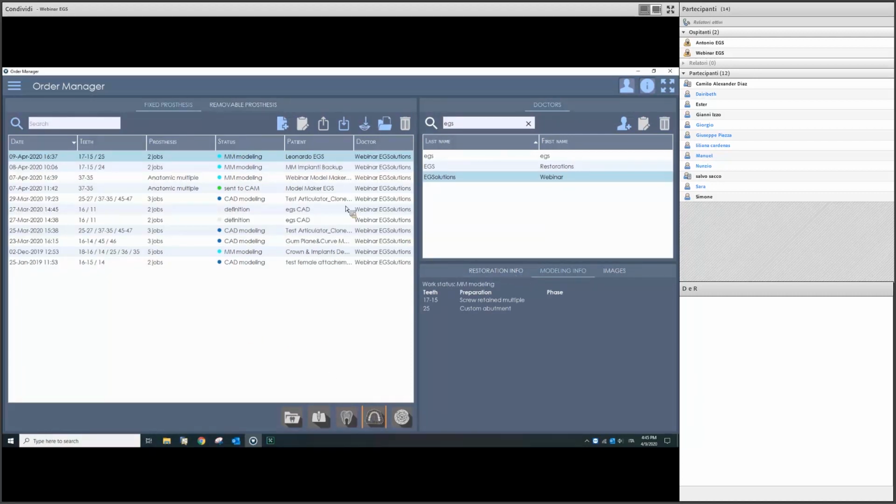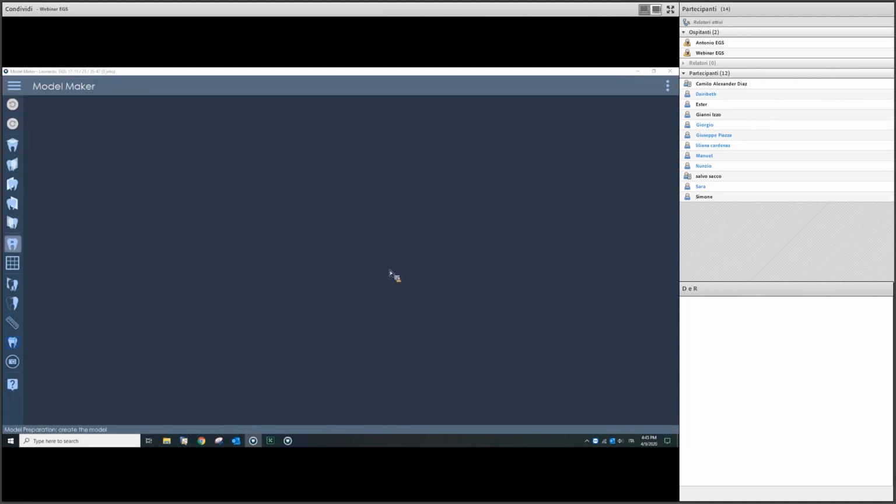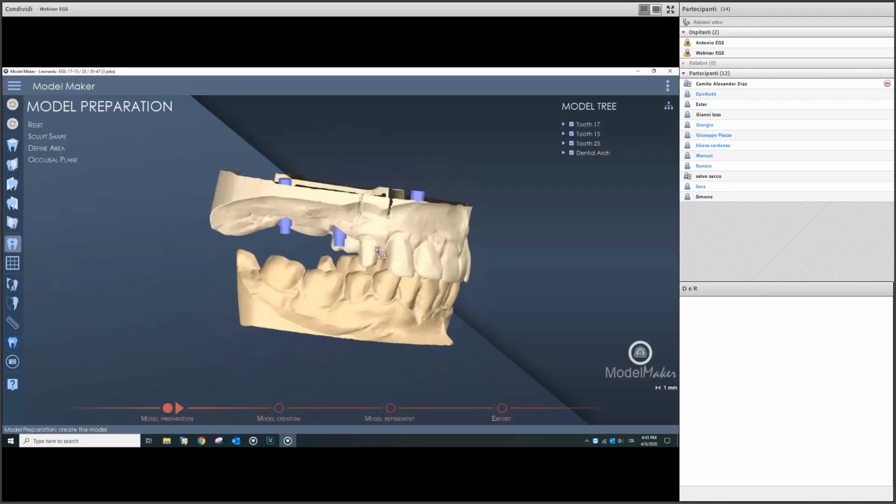As you can see here, in general, I have some information related to my restoration. Okay, so here we are.